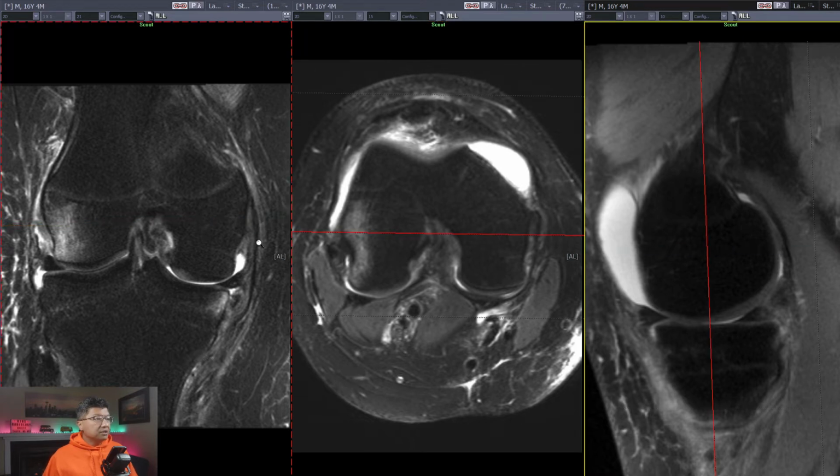It's this big thickened structure over here, and that's of course the medial collateral ligament, also known previously as the tibial collateral ligament. Now this ligament gets thinner as you go posteriorly, and at the posterior aspect it is now known as the POL, or the posterior oblique ligament. The posterior oblique ligament makes a turn around behind the medial femoral condyle, and when it makes this turn, it is then known as the OPL, or the oblique popliteal ligament.